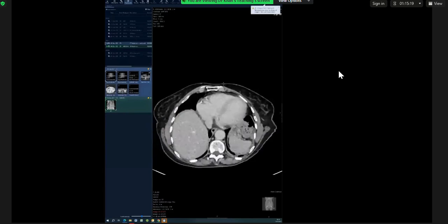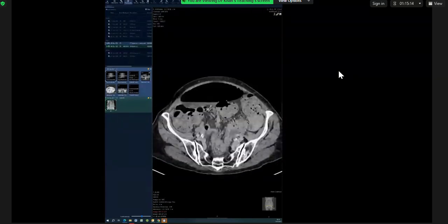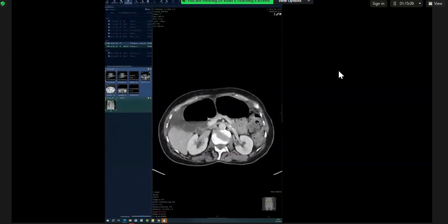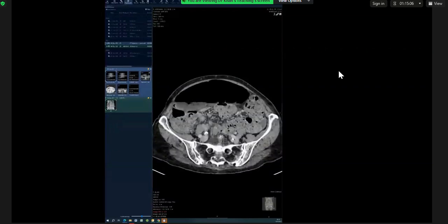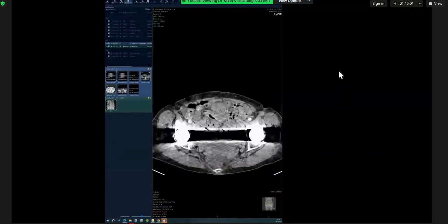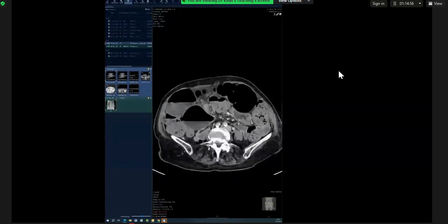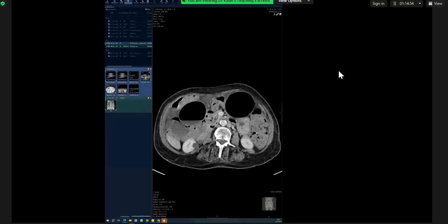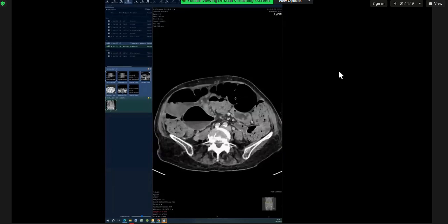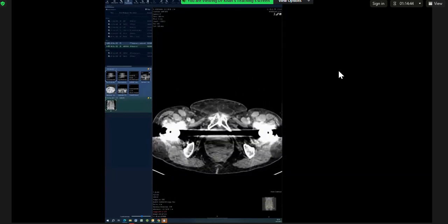Okay, so I would ask again that you follow the rectum up. This is the descending going up, ascending going down, so the transverse. So all this feces-filled bowel is the large bowel, and then there's this dilated loop that goes all the way up, turns on itself, goes all the way down. Does that confirm your sigmoid volvulus?